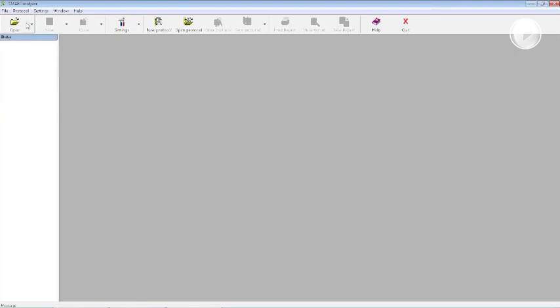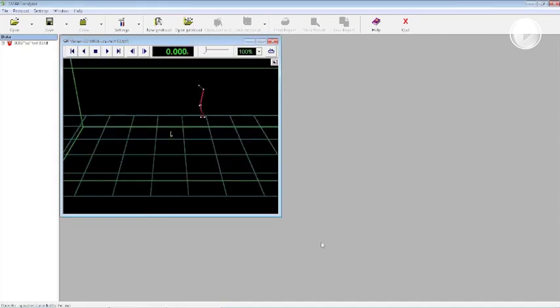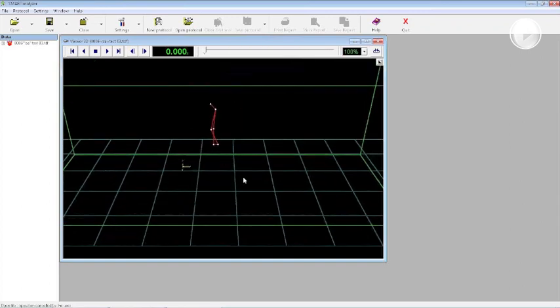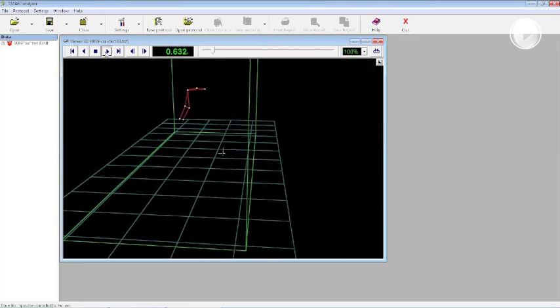In this case, we are going to click on Open. We are here, Webinar Upper Limb, and we select the second one that, as you can see now, has the 3 red dots, belonging to the fact that we tracked the trial. We open this file. Automatically, the 3D viewer that we saw before appears. And here we have our trial. And you can see that we just see what we tracked before.